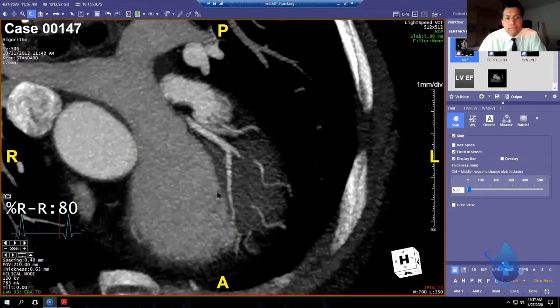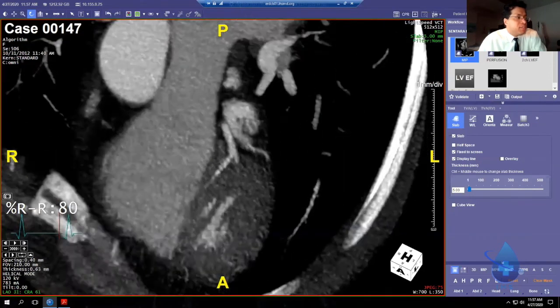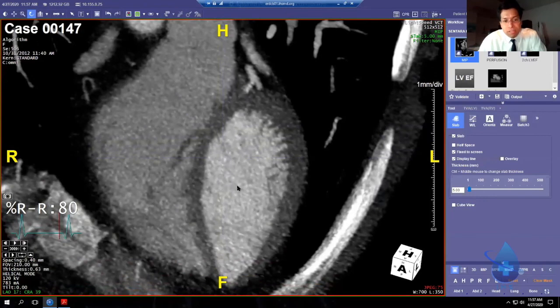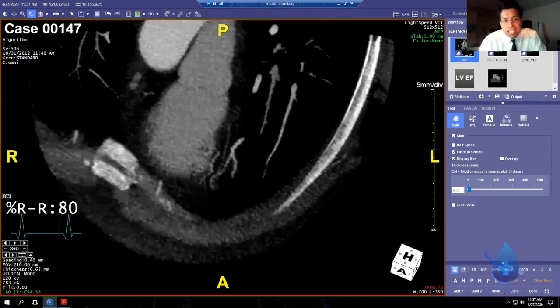Okay? Now, if you do it the wrong way, which is the left click here, and instead of rotating straight across, you left click diagonally into the screen. I went from here to here. Look where you end up, inside the ventricle. And that's because you didn't just rotate it on the surface, you rotated the entire data set into the ventricle, okay? And then you'll get lost.